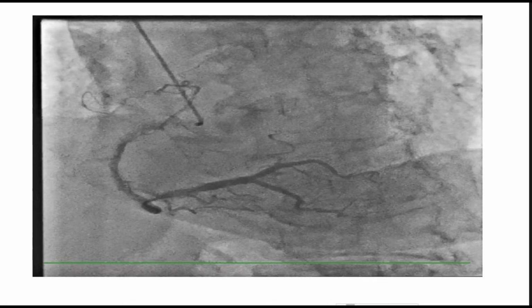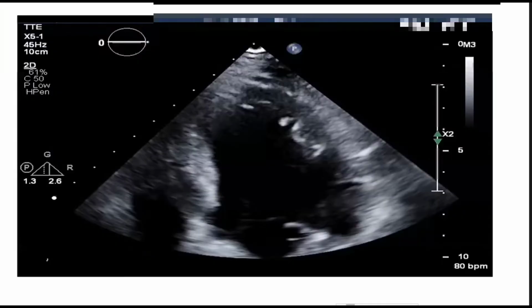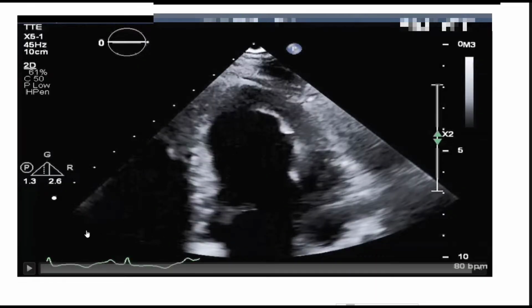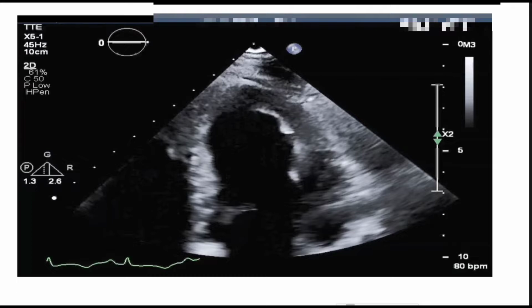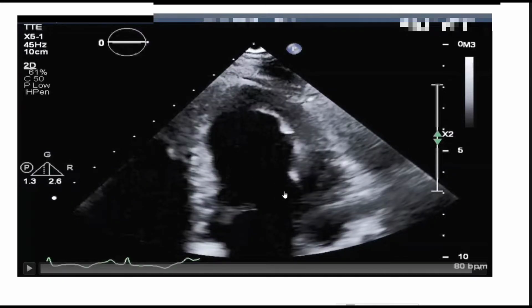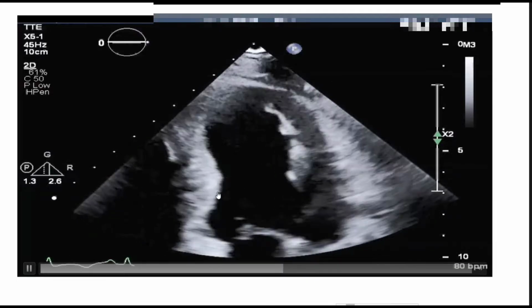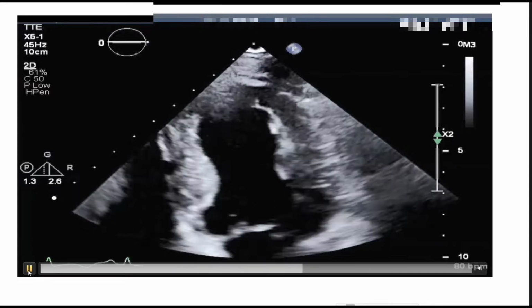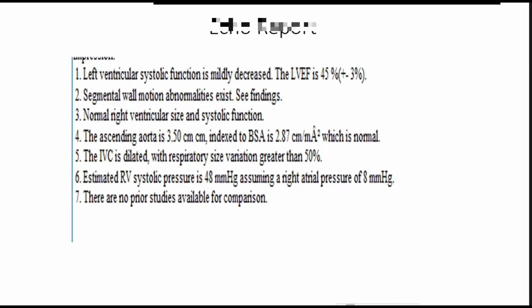I know it doesn't quite fit all the criteria for a Takotsubo's cardiomyopathy, but maybe something to consider is this person had an emotional hit lately? Well, all we know is she's traveled from California here to visit. Gotcha. So, what about some sort of coronary spasm? All right, so you could have coronary spasm, or you could have, and if we look in the mid to base is hyperdynamic.